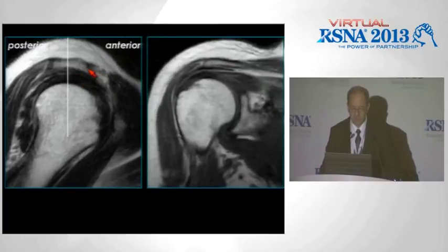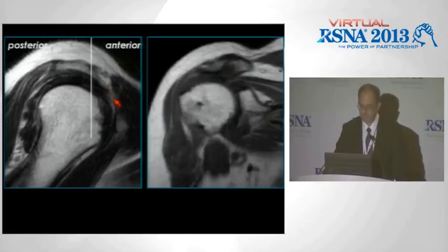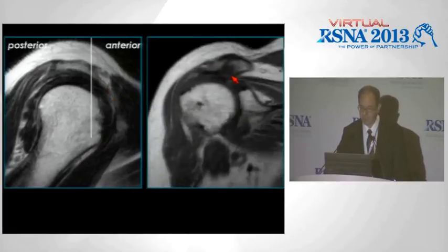So here we have a little spur coming along the anterior aspect of the acromion. And here as we come forward, we have a spur extending around laterally. So I would call this an anterolateral subacromial spur. Notice there's also acromioclavicular osteoarthritis, but again, this is more proximal.